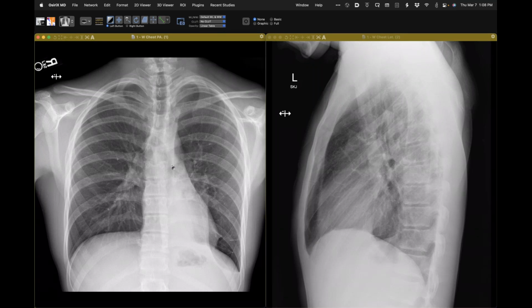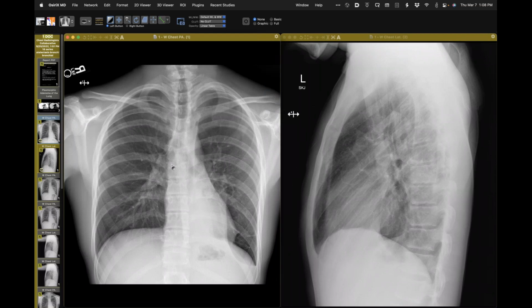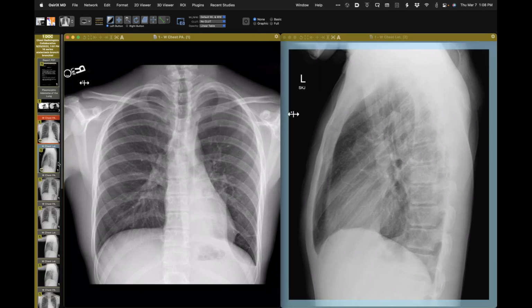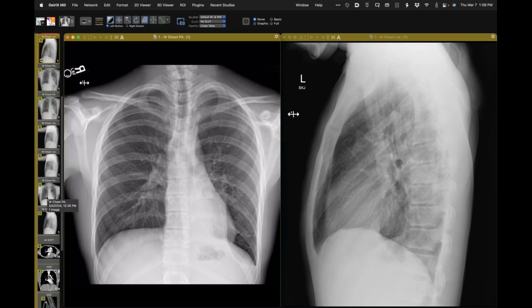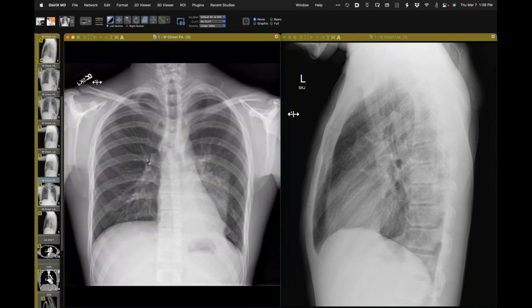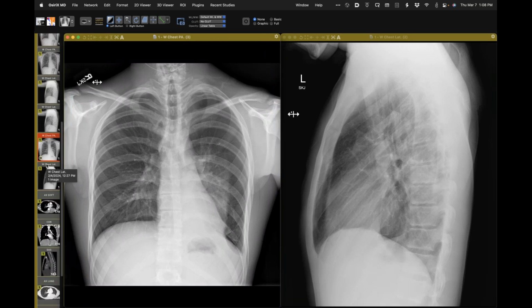So obviously he's had some symptoms over time, but they were not severe. And he came in recently again with, I think, an unexplained cough. And really nothing has changed over time. So this is from 2024. The same findings are present. There's a bit more opacity here, but the findings are those of obstructive left lower lobe atelectasis.